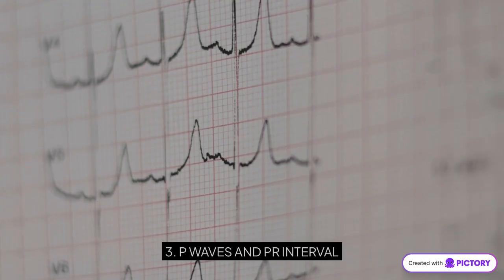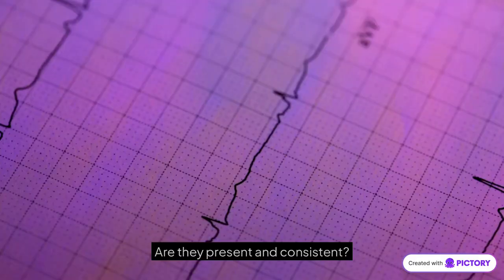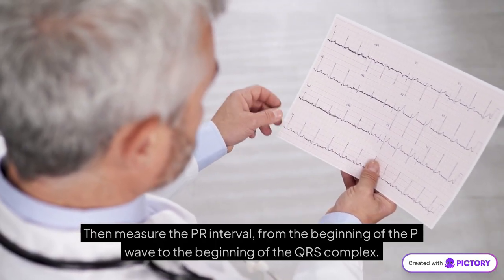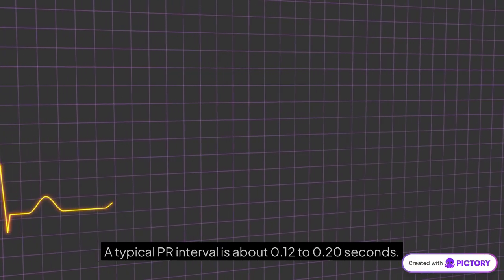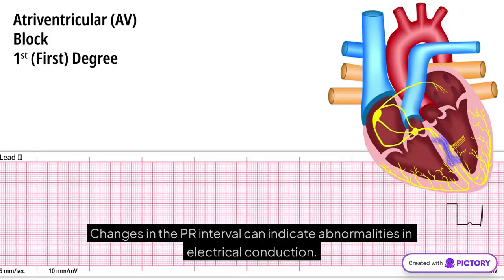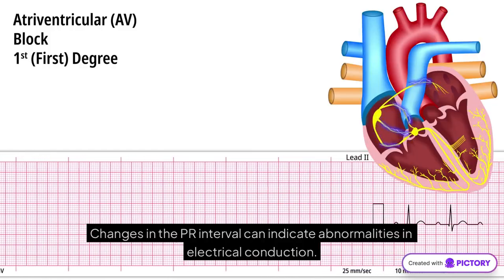3. P waves and PR interval. Now look at the P waves. Are they present and consistent? Then measure the PR interval, from the beginning of the P wave to the beginning of the QRS complex. A typical PR interval is about 0.12 to 0.20 seconds. Changes in the PR interval can indicate abnormalities in electrical conduction.